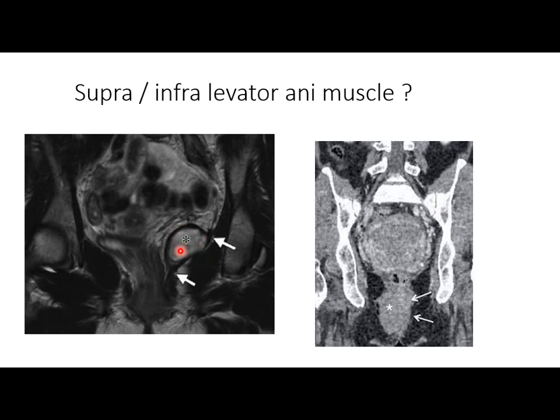Where is the levator ani here? This one, the first is above. This is supra, the second is infra. Yes. And this here is infra, because this is the levator ani.